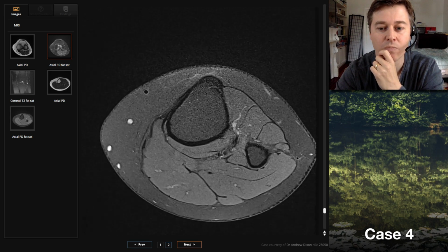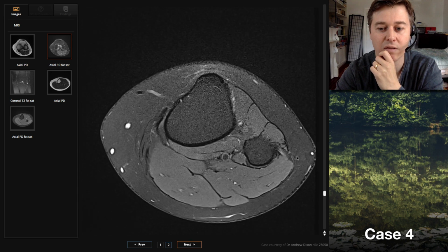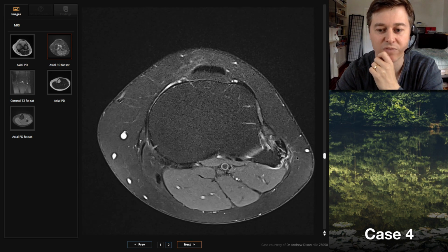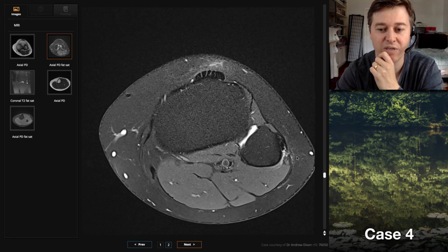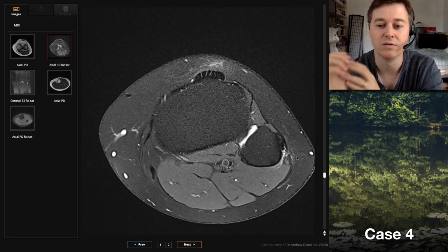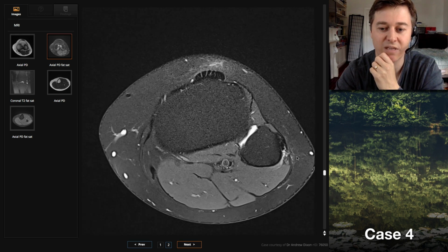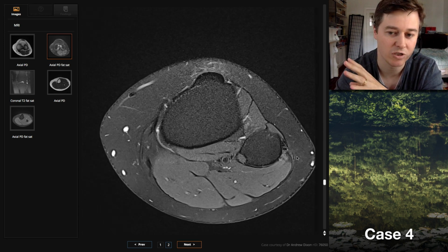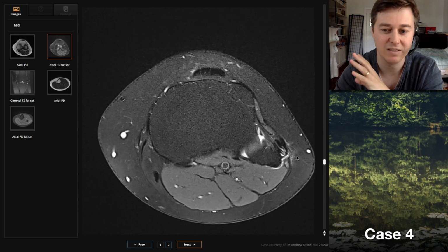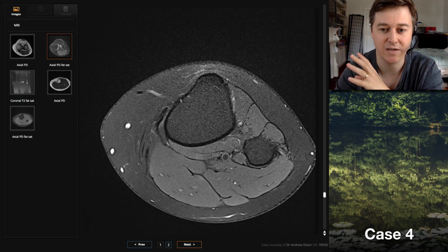I guess any sort of osseous abnormality, so any osseous lesion or outpouching. Yeah. So like a classic bone lesion at that site, which is growing outwards, would be like an exostosis. Yeah, exactly. An osteochondroma would be the thing. So you look for an osteochondroma, look for a ganglion, look for a nerve sheath tumor. None of that's happening in this case. In this case, there's just localized inflammation due to the tendinosis.